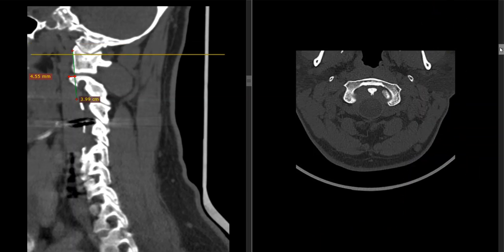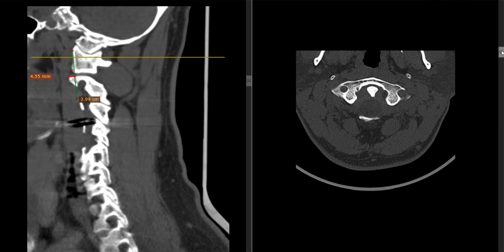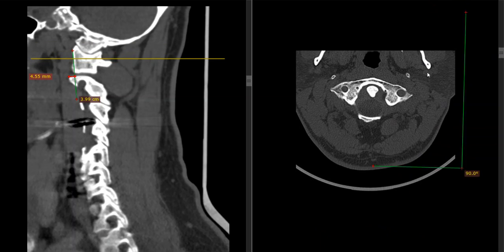Now this does not denote a lot of stuff. So we're going to look at C1 and see if C1's facing in the same direction. Let me get rid of this. I do not want that there. Now C1, I don't normally like to use the foramen, but I just do that as a starting point. Ooh, look at that, almost got a 90-degree right away.